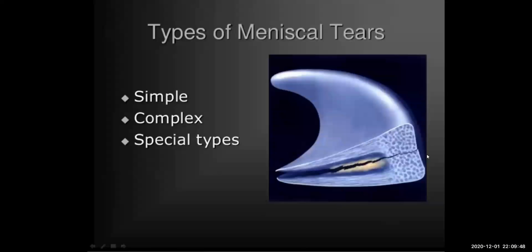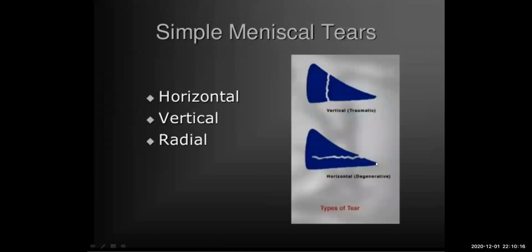Now, if the tail had been extended, started as this small, this extended all the way from the peripheral to medial. So we have like two leaves here. This is on the tibial side, this is on the femoral side, this is almost type 3. As I told you, in simple type if it is like one line, and if it is more than one line it will be complex, and there is a special type, diamond, being described according to the shape. And now two types of a simple line, and this is type 3, this is type 3.